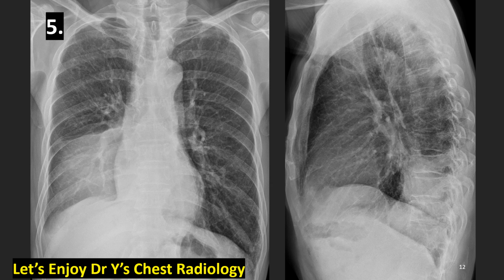What's the difference? On the frontal radiograph, we see the normal right heart border. That means the right middle lobe is okay. And also we see the normal pulmonary vasculature and airway all through this mesh-like, consolidation-like density. What is this? And we see the right diaphragm margin and a relatively clear right CP angle area.